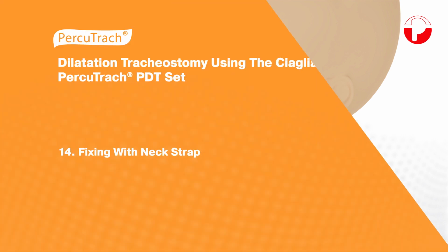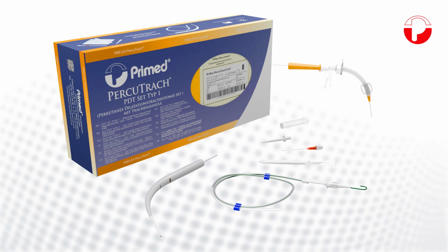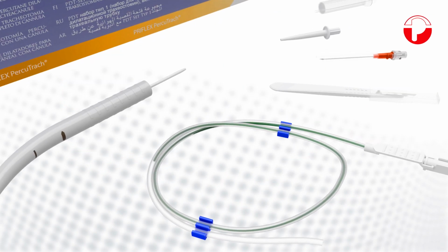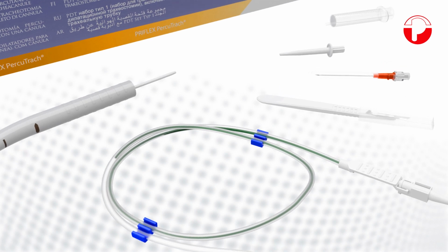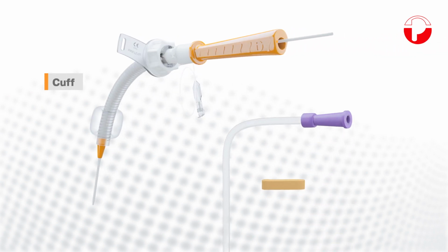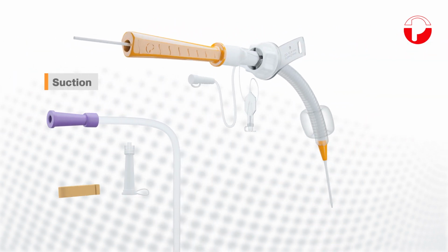The PercuTrach PDT set for stepless dilation is available in various versions. The dilation set can be combined with the Priflex PercuTrach tracheostomy tube with cuff, suction with cuff and subglottic suction function.